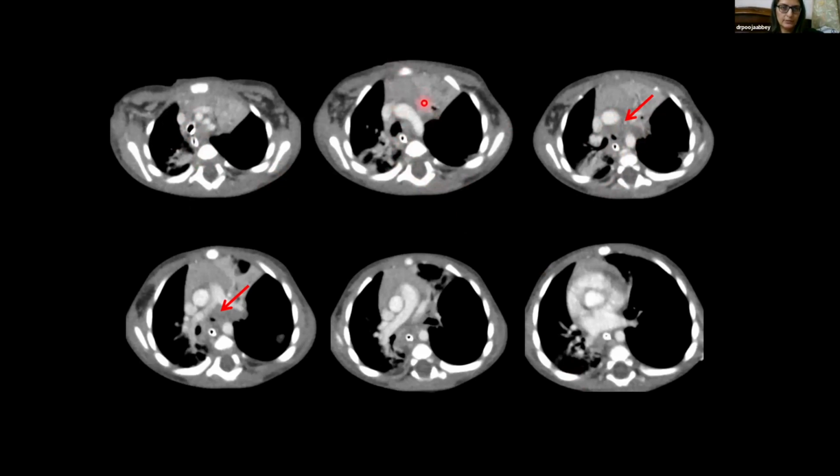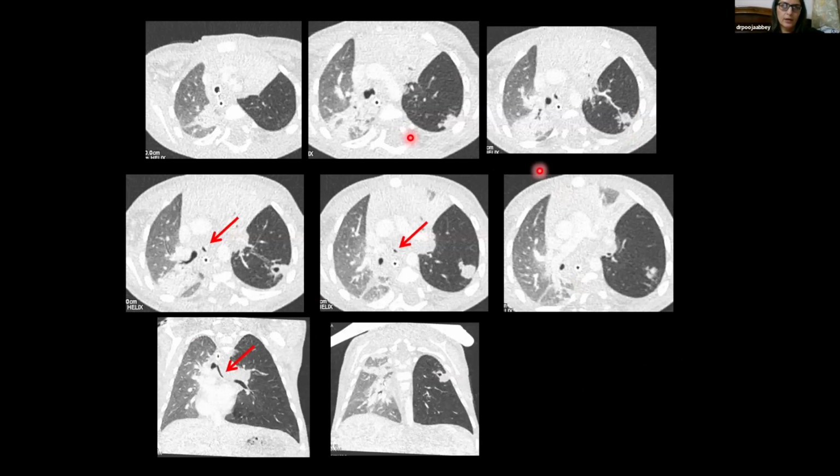This is thymus anteriorly. This is a part of the collapsed left upper lobe. Okay, so this kind of wedge-shaped opacity here with some sort of fluid bronchogram which is seen within. That's a part of the collapsed left upper lobe, and those are the great vessels. So there is some soft tissue which is seen here in the mediastinum, and this is closely related to the airway, and it's causing narrowing of the left main bronchus, which is seen here.